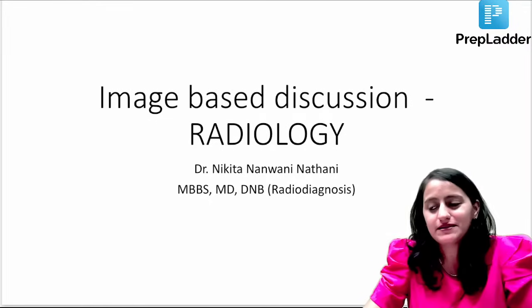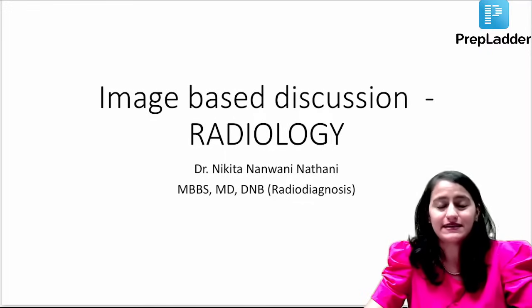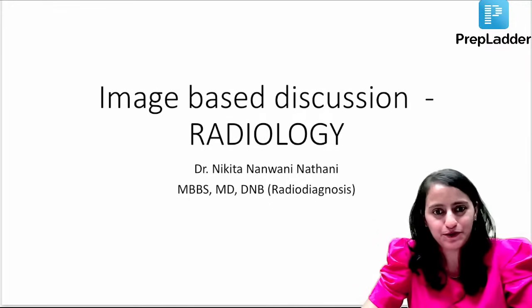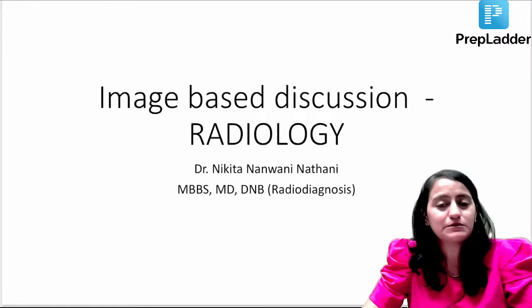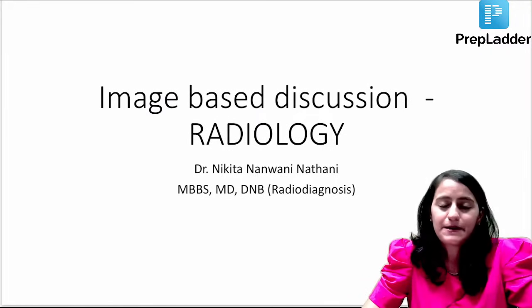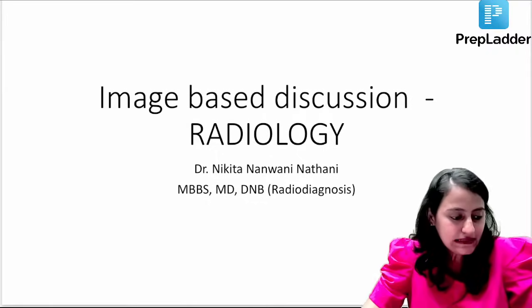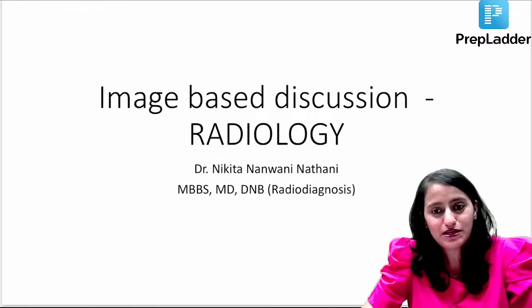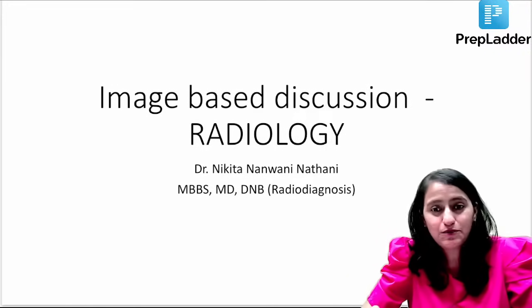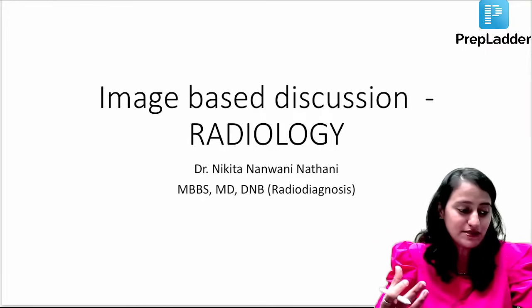Great. So here we are into the image-based discussion. We'll be discussing the important, must-know images in radiology. For any exam that you go to, these are the images that you definitely have to know. We'll also understand how to interpret the black and white of radiology, so that if you get images beyond this in your exam, you should be able to interpret them. We have seen in recent exams there are radiology images which might be a bit eccentric, but if your black and white principle is well understood, you'll be able to interpret those images as well.